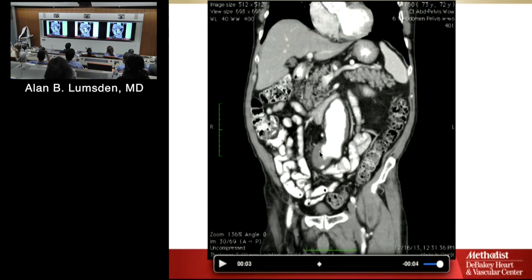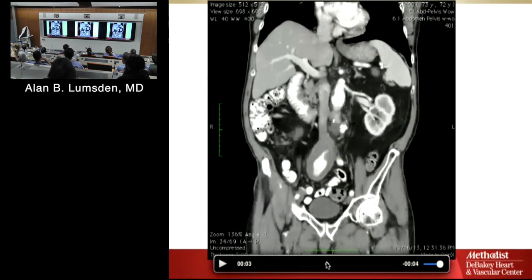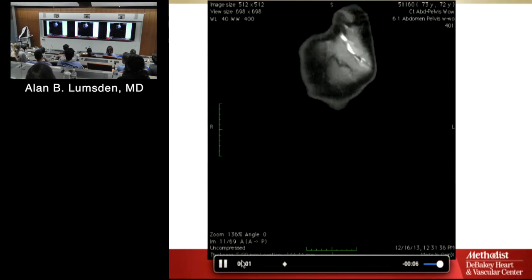What's this? Speak up. Thrombus. Okay, thrombus in the wall of the aneurysm. So when you measure the diameter of an aneurysm, what do you measure? Outer wall to outer wall. Okay, is this an aneurysm of the inferior vena cava we're looking at here? No, this is just the way the slices are cutting down through this. This thing's pretty sensitive this morning.